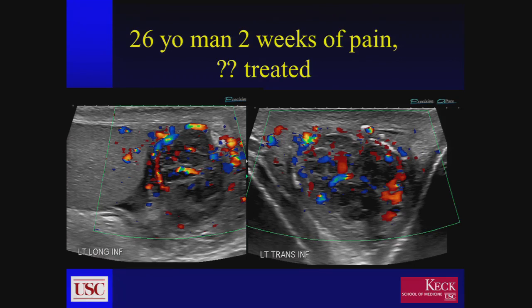when I actually talked to him, his English, shall we say, wasn't very good, and it turns out he didn't really understand the fact that he was supposed to take those pills that they gave him. So unfortunately, he really never adequately treated his epididymoorchitis and came back now with a developing abscess. So this is a classic finding, again, multiple cystic spaces.